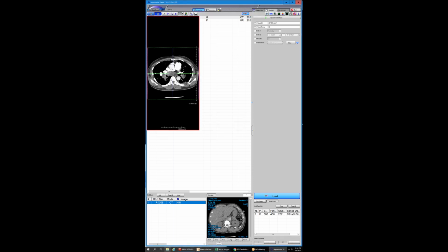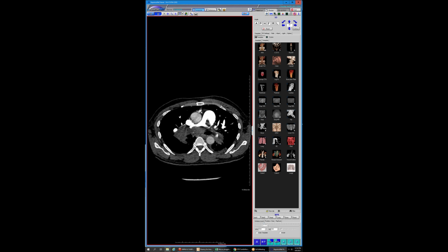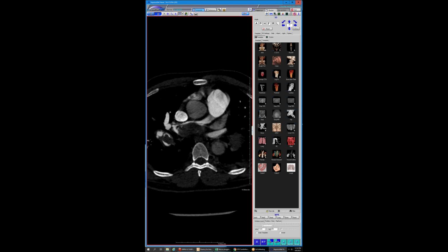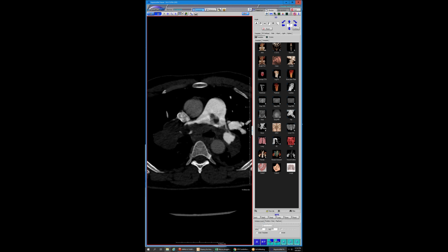Mm-hmm. This is a case that came in as a resolving PE, and I think, well, some of this you could look at this web, and again, I have to write this paper up. We now have so many sarcomas. My going theory is once you see a web, you should be pretty convinced that it's not a sarcoma. But now I'm going to have to change that and say if it's a web that's remote from the actual primary mass. So this patient's going to surgery.